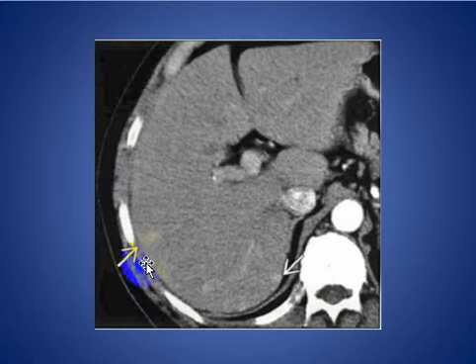As we see here in this patient, a peripheral small wedge hypervascular lesion is seen in the arterial phase of this patient with cirrhosis, typically THAD or AP shunting lesion.